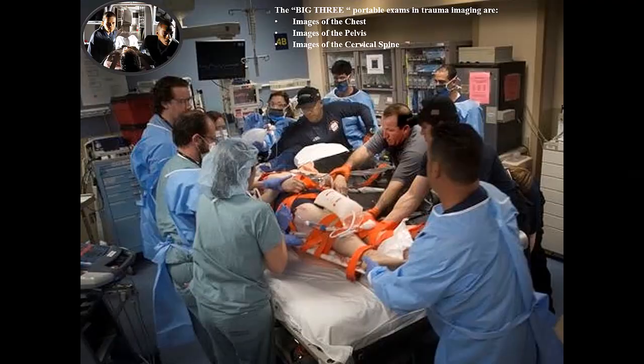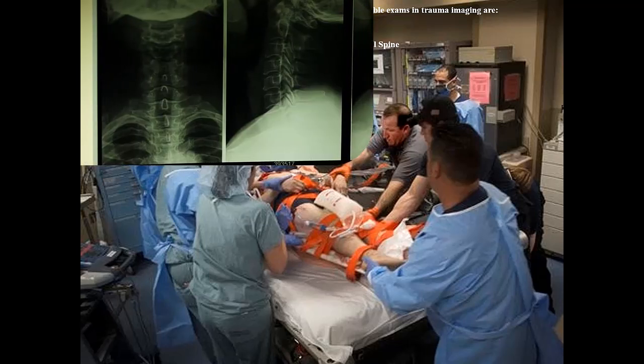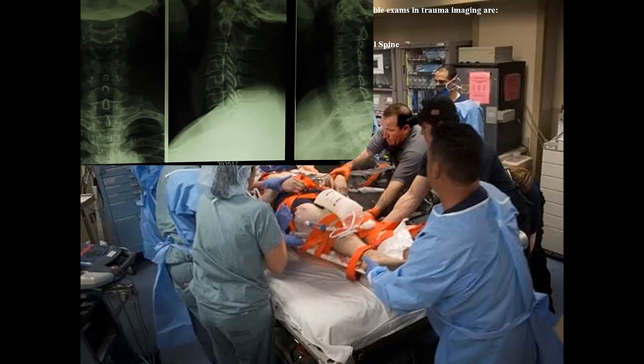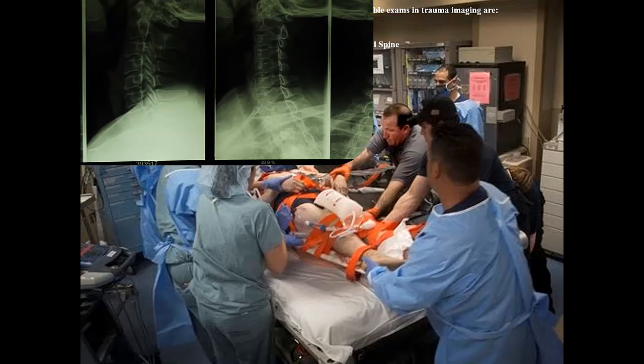The AP pelvis exam is crucial to determine that major vascular structures are not compromised and the patient is not subject to bleeding out. The cervical spine is often requested first by inexperienced ER personnel, but as long as the spine is stable and immobile, the chest and pelvis should be taken first.